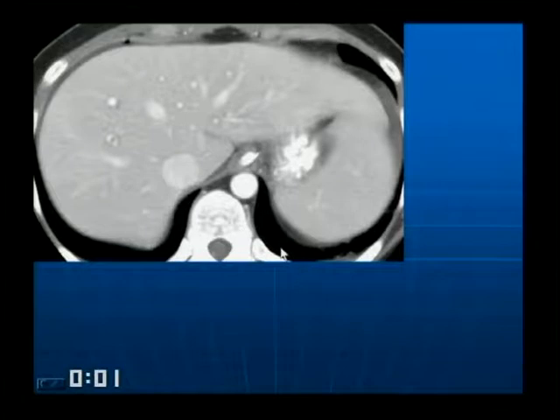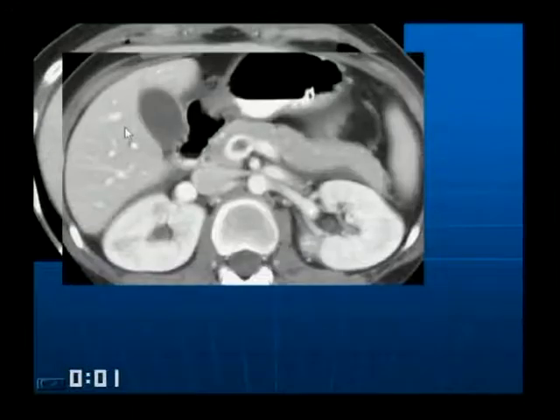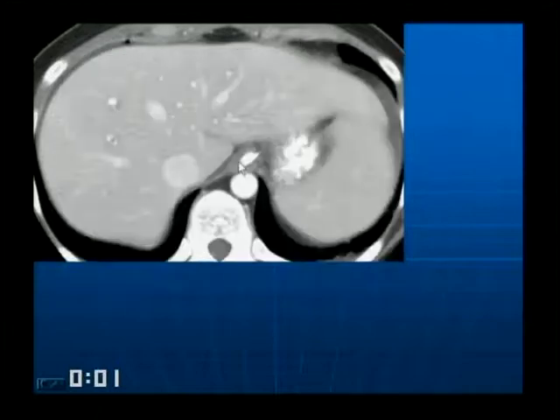Now the patient had a CT scan. Here's the top cut. I'm going to help you a little bit as I show you the rest of these. What's going on? Right, SMV thrombosis. So the patient has actually developed thrombosis involving, here's the confluence. This is splenic vein. This is the confluence. And if we go back to that previous cut, you could actually see that these are hepatic veins. So these are intrahepatic portal veins that actually have thrombus. So the thrombus has propagated to involve both intra and extrahepatic portal venous system and superior mesenteric vein.